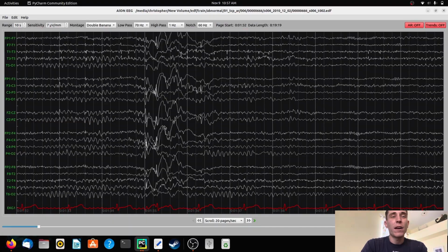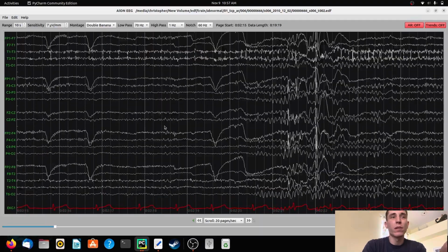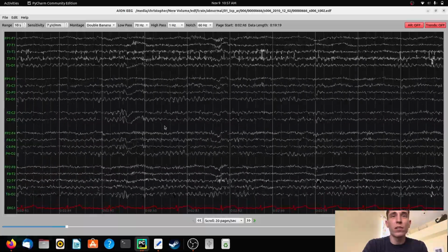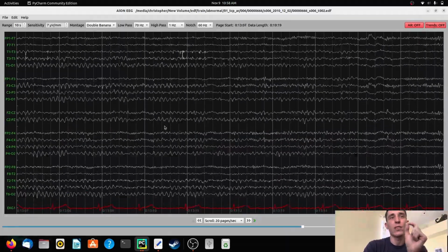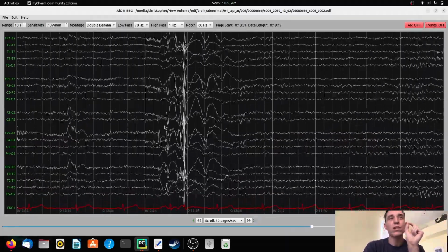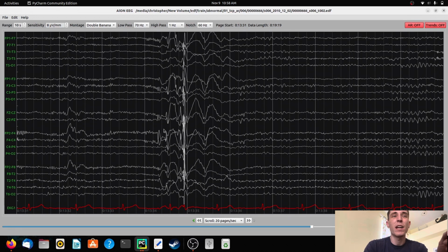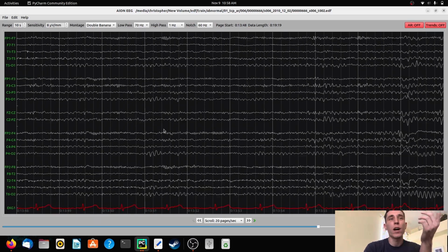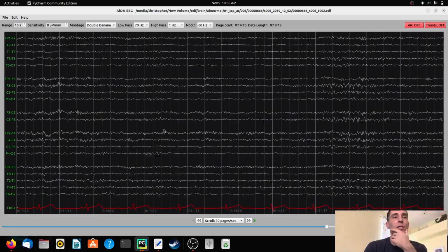But they keep having these spike and wave discharges, which are predominantly in the frontal region. There's more eye blinks for you. There's another more spike and wave discharges. Scrolling through the whole EEG. Now, these are not seizures, guys. These are actually called interictal discharges that happen between seizures. Now, the EEG tech, during these spike and wave discharges, tests the patient's awareness. They ask them maybe a code word, tell them to remember like blue dog, red truck, something like that, and test their consciousness during these discharges.